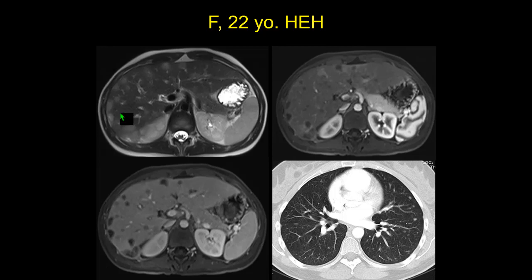And once again, they are mostly located in the right lobe, they are mostly peripheral, they are mostly subcapsular, and they have a rim enhancement in the vital part. The central part is a desmoplastic component, and in about 30% of the cases we can see extra-liver localization of this lesion. This lesion can be resected if single, or go to orthotopic liver transplant, the only way to cure these lesions.